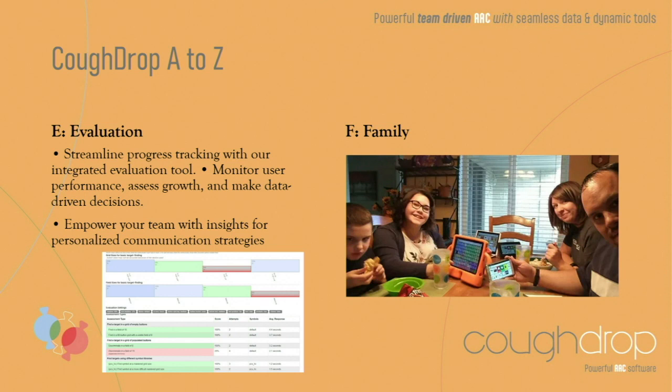Evaluations, my favorite. How many other people love doing evals? All that report writing, all that fun data tracking, right? With the evaluation tool that's built into CoughDrop, it's similar to AAC Genie. I can run through it, and it's going to give me a ton of really good information. The cool thing with this is that I can run it on my account. I don't need to create an account for every user that I'm doing an eval.